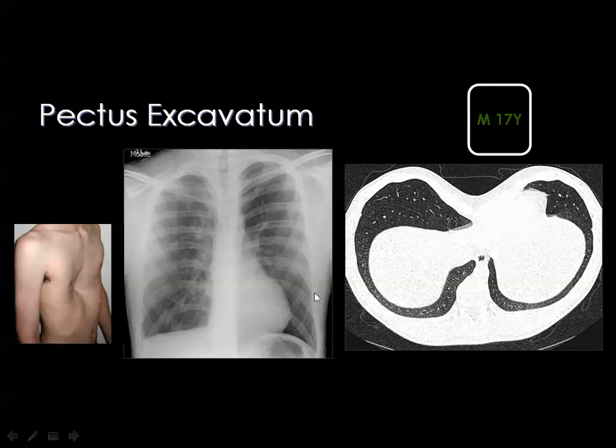And of course, when you look at the chest X-ray, you must realize that the patient is well centralized by measuring the distance from the spinous process of the dorsal vertebra to the medial edge of the clavicle on the left and on the right. These distances should be equal. Then you know that the patient is not rotated. In such a case, whenever you cannot see part of the heart to the right side of the spine, you may guess that the patient has a depression of the sternum, and you can look at the lateral view.